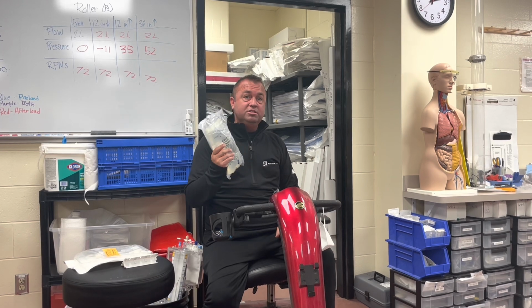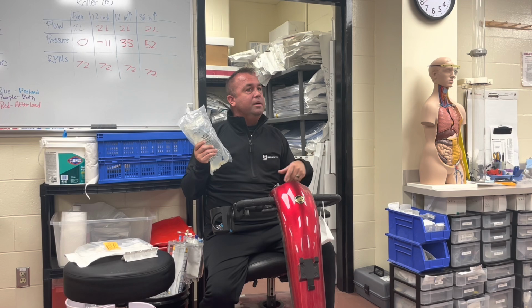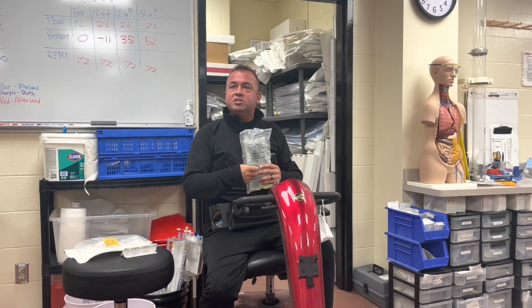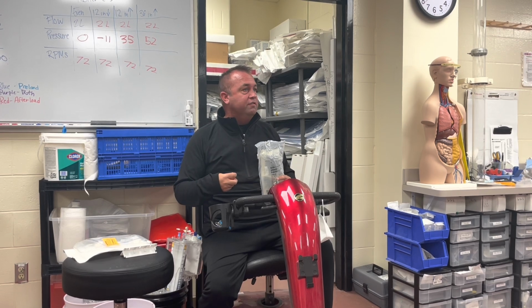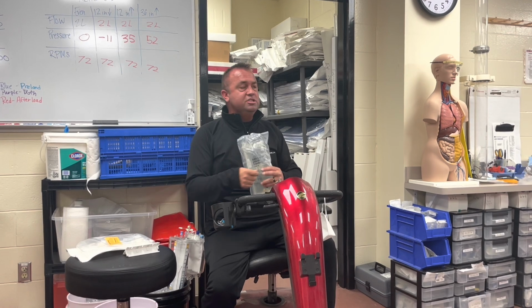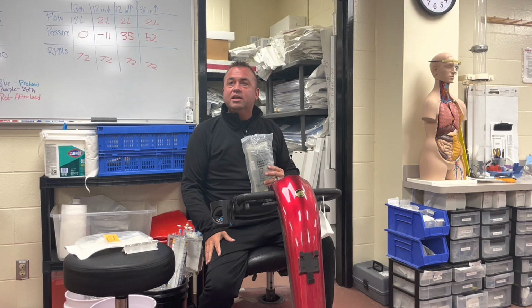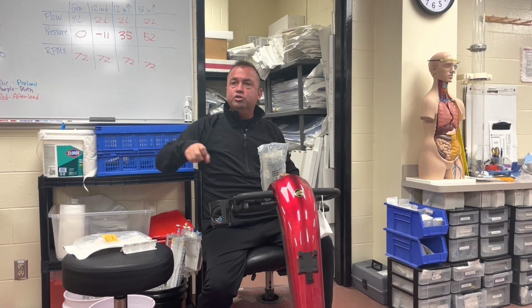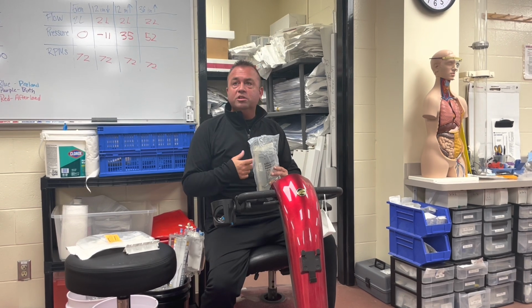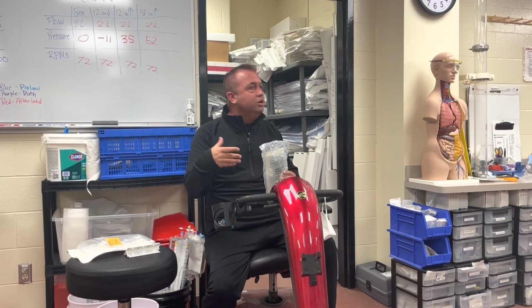So we've tried to save these patients that initial heparin exposure, and we use regular saline. Now, does regular saline work as well as heparinized saline does? Not as much. So you have to make a conscious effort to flush that transducer once in a while, especially when we do blood draws off of that transducer. Make sure that we rapid flush that until it's all the way clear. Some people even draw some fluid back in a syringe and flush that, and even check all the way under the drapes to the arm to make sure that line is completely devoid of blood and flushed with clear fluid, so we don't get the transducer setup and the catheter to clot off.